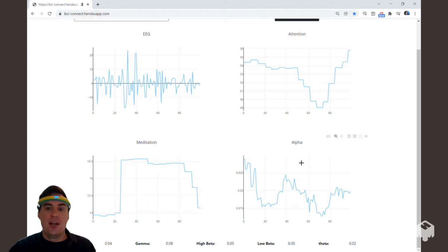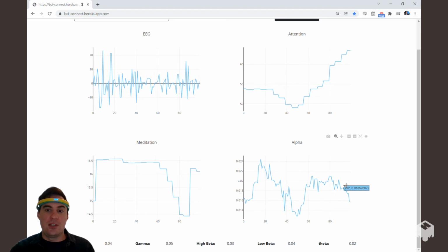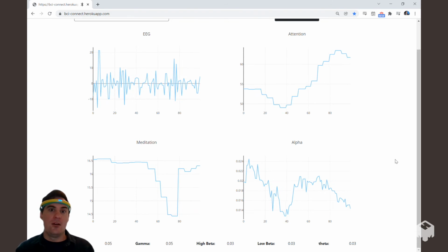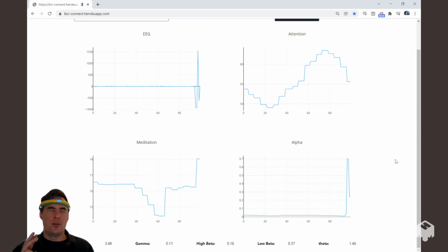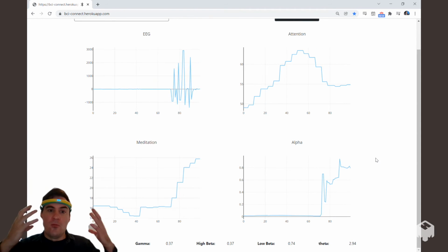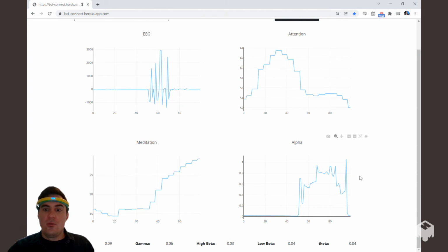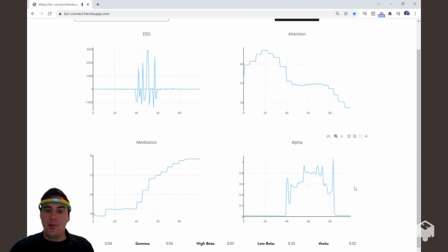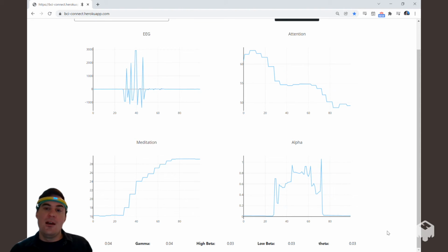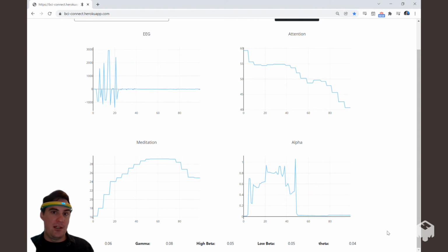But just to show you, let me blink 4 times once again, and let's see what our alpha waves do. We should see this go up. Ready? And 1, 2, 3, 4. Look at that. We have some more peaks. The more I blink, we have some peaks here in the EEG. We see our alpha readings go up. I stop blinking, the alpha readings come down. And those are just a few simple things that we can do to see this kind of correlation.